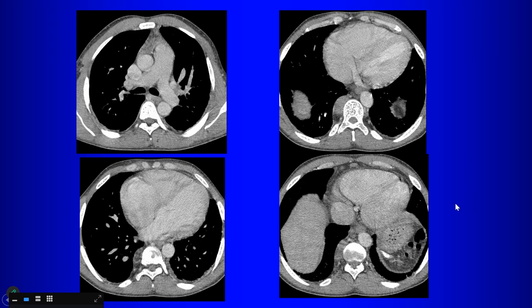So first, if you're just looking at the CT, what tells you that the patient has sickle cell disease? What do we call that? Yeah, so this is autoinfarction of the spleen. You have a small calcified spleen, so that, of course, is associated with sickle cell disease. Okay? The bones are somewhat sclerotic looking, the vertebrae here, right? Of course, we can also see that.